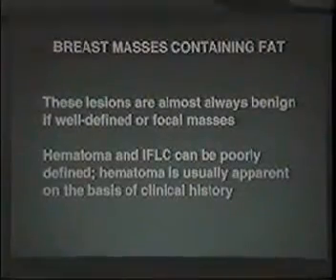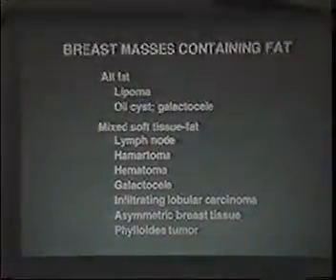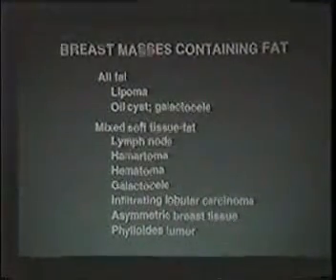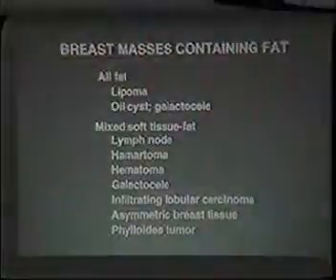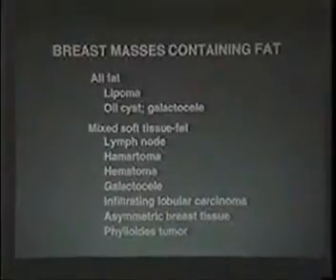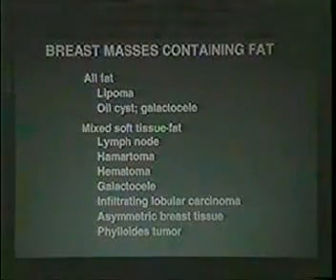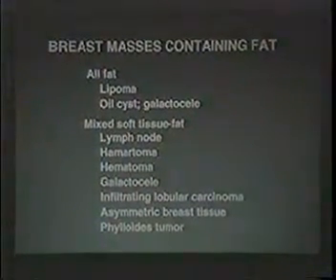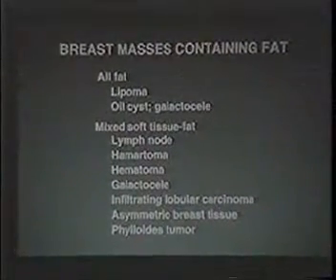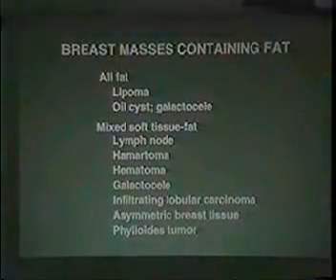So the more irregular, the more lobulated, the less round and well-defined a mass is, the more it has characteristics suggesting the possibility of malignancy. So that's why the very accurate evaluation of shape of a lesion is pivotal in determining what it is that we're going to do in terms of any further workup of it. Now let's look at some special kinds of cases on mammography and some of what are unfortunately the few instances where we have a focal lesion on a mammogram and we can actually make a diagnosis of what this represents.